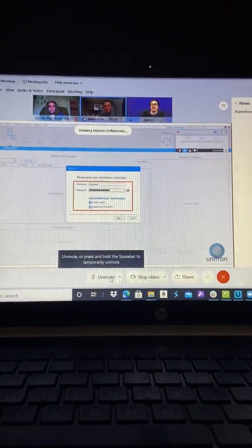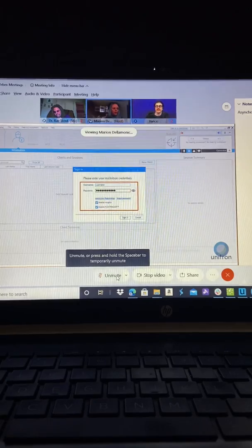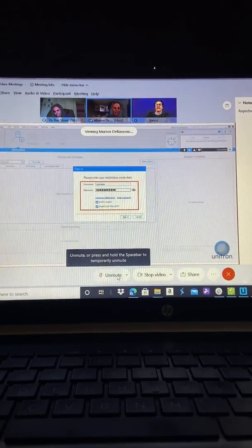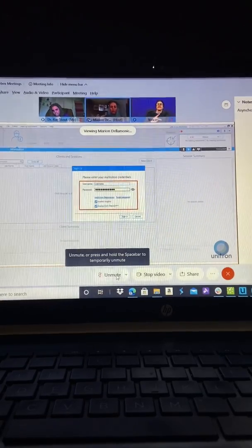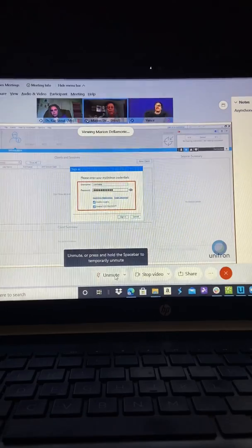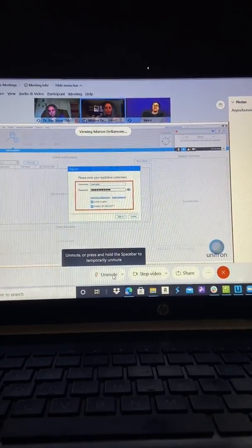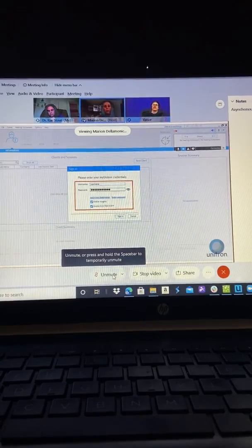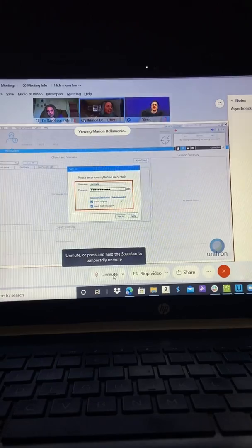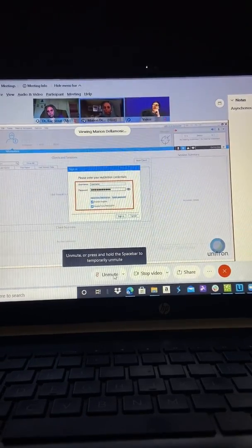Adjust is part of our Insights features, so it has to use Insights. Okay, and I would recommend to you guys to have Flex Tracker checked, because then if you have Flex trial devices out, you don't have to keep a running tab of who has what, when did they go out, what serial numbers. We do it for you, so you don't have to keep track. I can't read serial numbers anywhere, so this is beneficial for me. And then that's just a one-time process.